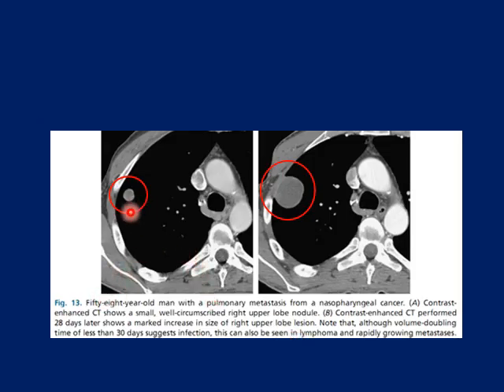Again, metastasis, small, and on follow-up, as you see, the doubling time was less than 30 days. This is a very aggressive tumor that doubles very rapidly. Of course, this patient doesn't have fever, doesn't have features of inflammation, and no other primary.